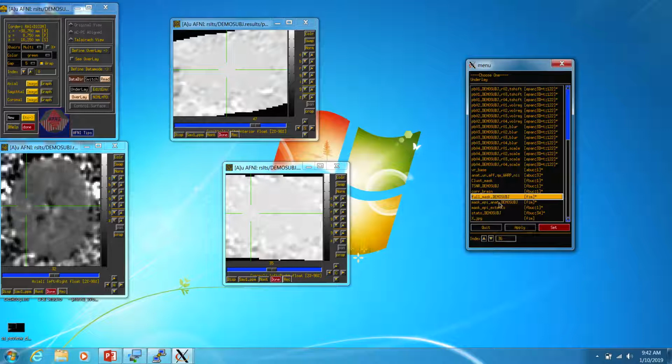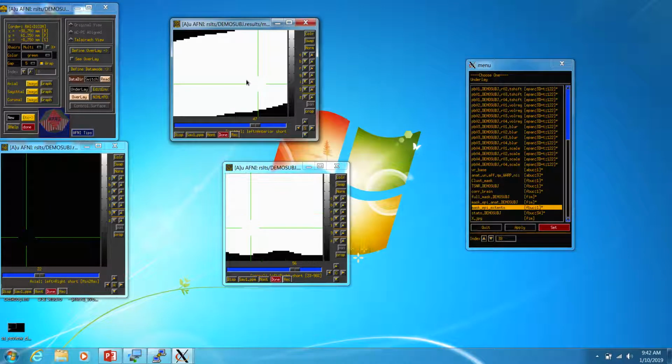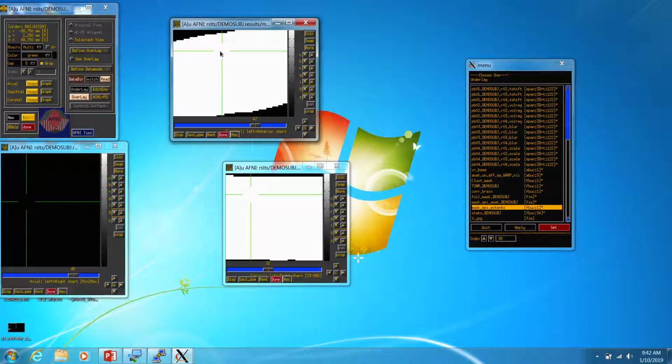The other thing that's useful to see, so there's a bunch of masks that are generated. We don't end up using very many of them, but I just wanted to show you one of these guys. So let me go ahead and bring that up. So this is the extents mask. It doesn't look very informative, but what's actually going on here is throughout the brain, there's some areas that are clearly not even part of the scan, and those get excluded.